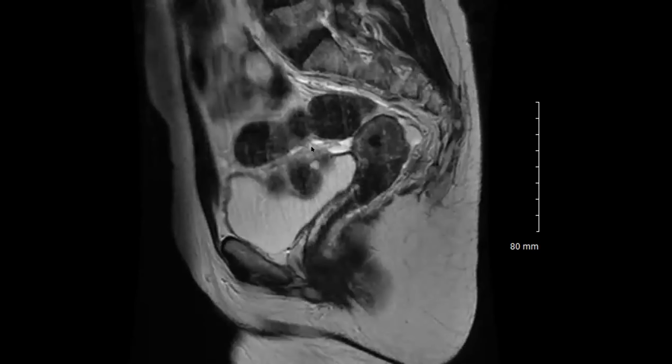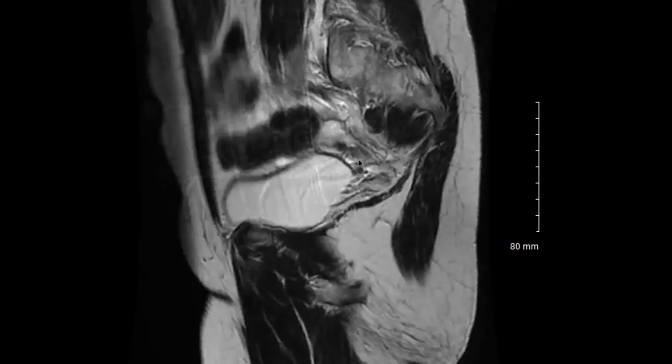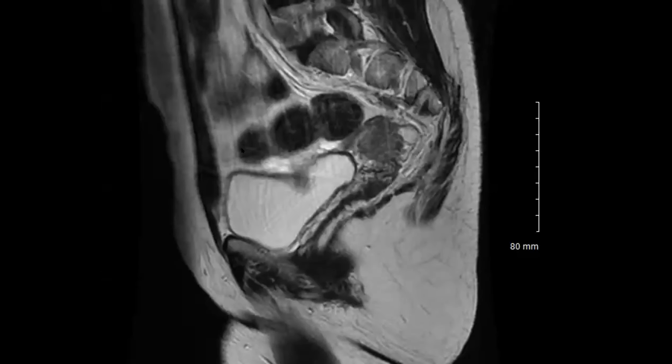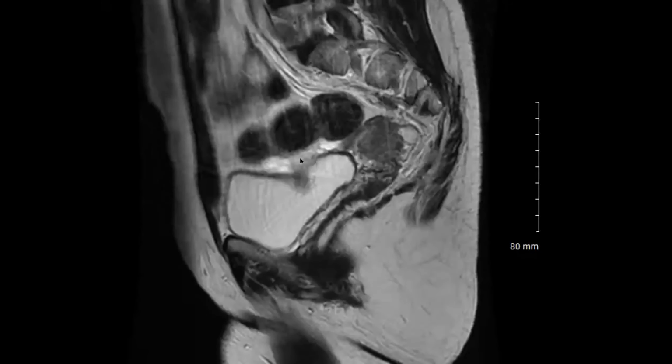So anyway, just completing this case, and then we'll go to the article. There were many small cystic spaces on the surface of the urinary bladder. The case that I'm showing is not as classic as what is shown in the cookie jar cases, but these were mainly in the pelvis. We went back to the CT. CT has very poor sensitivity to detect these tiny cystic lesions in the pelvis. None of them showed any enhancement. I'm going to stop sharing my screen here and then show you the cookie jar case that I brought up, which is more classic.